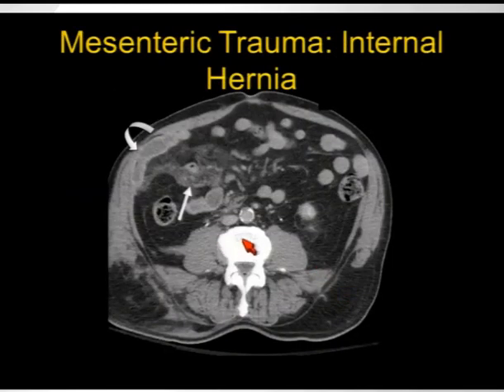And some more rare findings that are also important to be detected with CT, illustrated in this case. Notice there is a large abdominal wall hematoma. Again, always be very suspicious when you see an abdominal wall hematoma of this size, because that's the patient that has a much higher likelihood of having pancreatic injuries, vascular injuries, or bowel trauma, or mesenteric trauma.